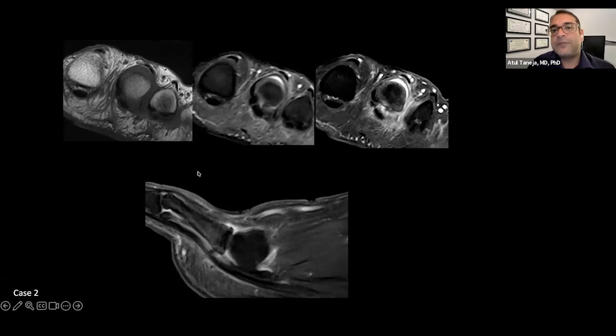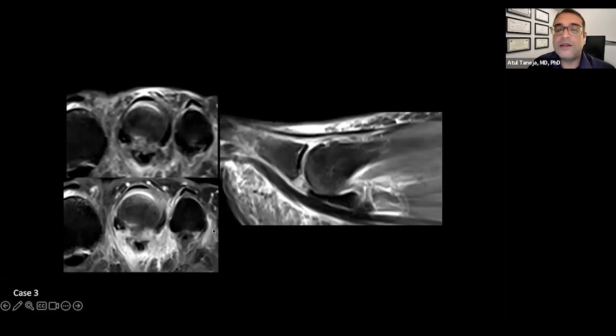All right, another case, very similar: large defect at the lateral aspect, some contrast enhancement there, scarring there. It's effaced, with proximal retraction, joint effusion, edema, and bone edema at the proximal phalanx. All right, what about case number 3 here? We see a defect on both sides, medial and lateral, with a large defect seen on the sagittal and a huge proximal retraction.